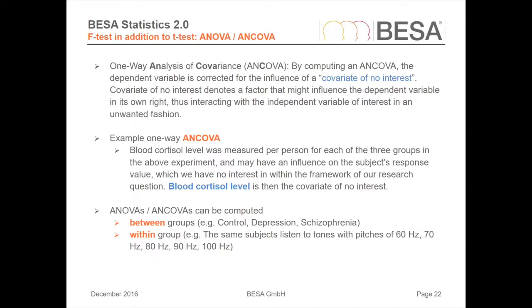The ANOVAs and ANCOVAs can be computed either between groups, so this is the example that we just talked about, or within a group. For example, the same subjects listen to tones with different pitches or different intensities.